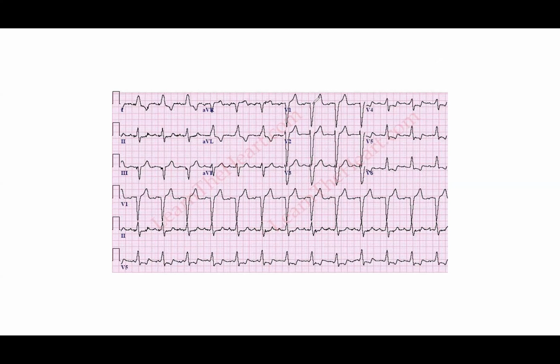Well, if you come looking around here, you'll notice that this QRS is a little bit wider than it's supposed to be, right? Got a wide QRS. So if I got a wide QRS, is it a ventricular rhythm? Is it a bundle branch block? What's going on here, right? But I know that I got P waves, so it means it's not a ventricular rhythm.